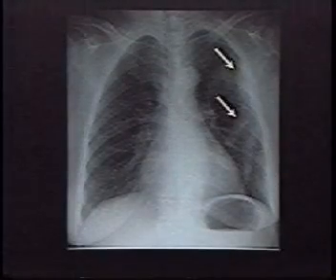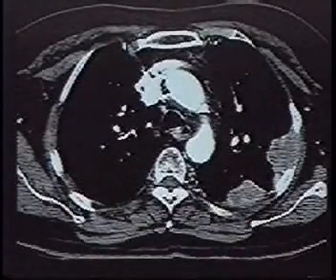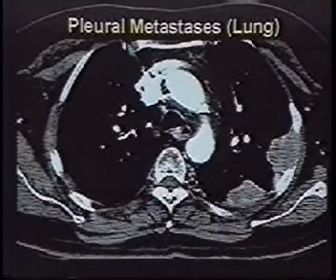And this patient has multiple pleural masses studying the pleura on the CT. And this is from a bronchogenic carcinoma primary.